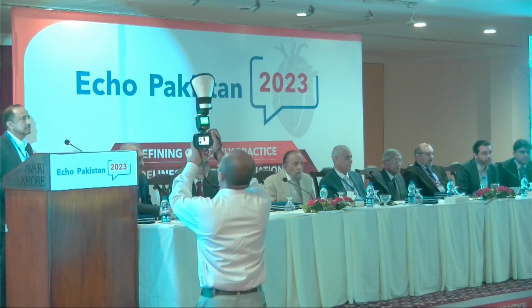I'm Dr. Shajil. I'm a big fan of your teaching. I have a question regarding paraprosthetic leak. We've been doing transesophageal echoes routinely on paraprosthetic leaks for mitral valve, but I would like your take on it. What measurements do you prefer in context of percutaneous repair, device closure of the paraprosthetic leak? Do you prefer 2D measurements or 3D measurements for that? And how do you size the device and what devices do you use?